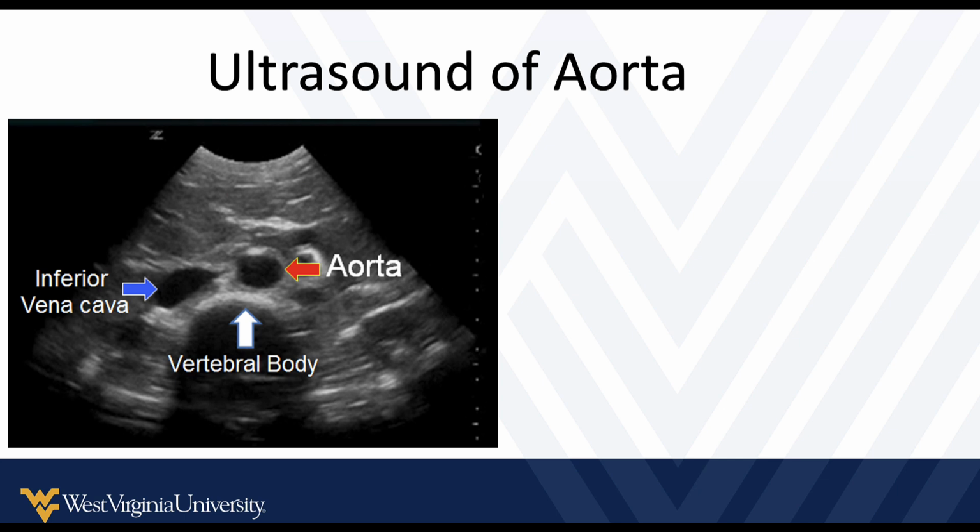Real quick reminder of the anatomy. So here we've got a transverse view, and this is kind of close to the epigastrium, it looks like, because we see part of the left lobe of the liver. Always identify that vertebral body first. That's kind of your first important landmark.